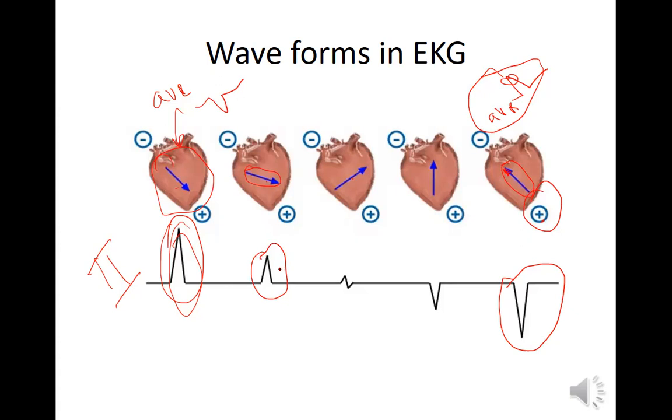Even in a normal axis heart, your QRS is fine being at this amplitude. Your R wave anyway, or QRS. You don't really have to have a Q or an S. And this is isoelectric, so kind of in between, halfway. This is how we plot the perpendicular line, and you draw an angle and get the number.